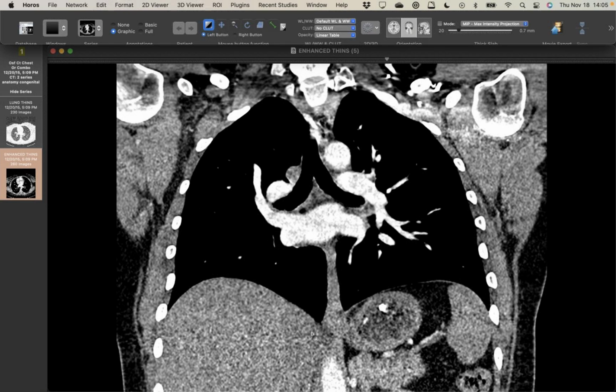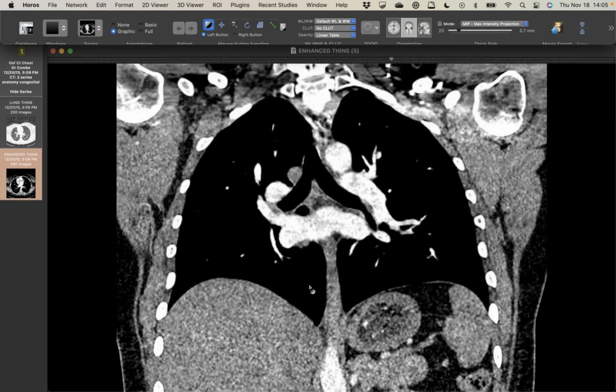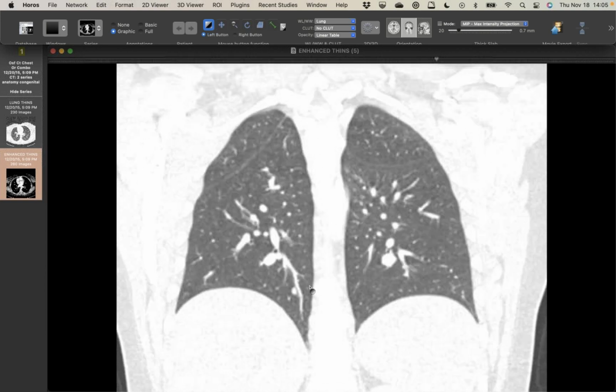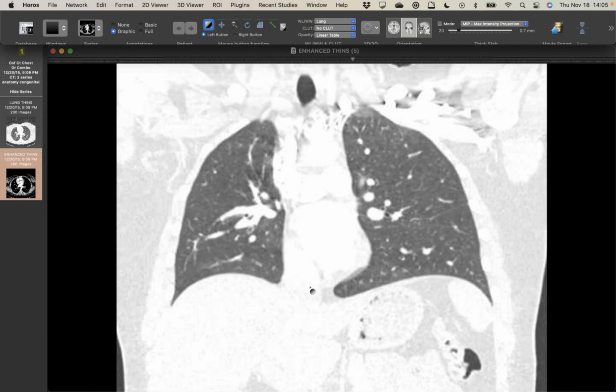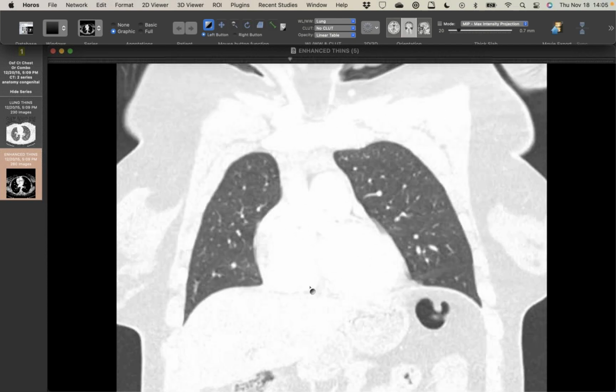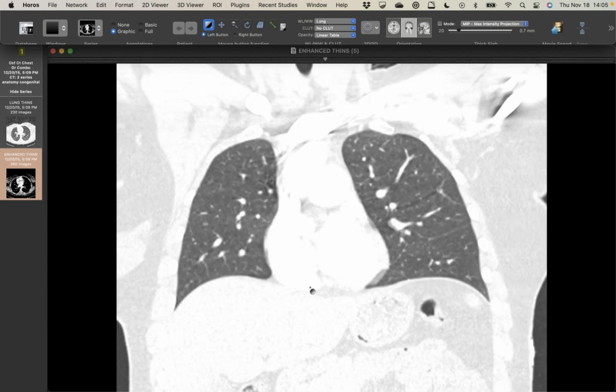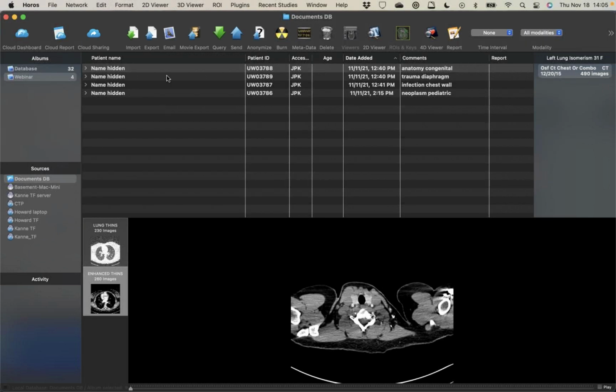There's normal situs in the belly, purely incidental, but kind of a neat finding where you have morphologically two left lungs. I've never seen right isomerism. I suspect it's probably associated with a lot of congenital anomalies, and that's probably why not. But I see this every so often. So it's just a reminder to trainees, you've got to follow the airways out and always look for that normal branching pattern. So just a little incidental finding.